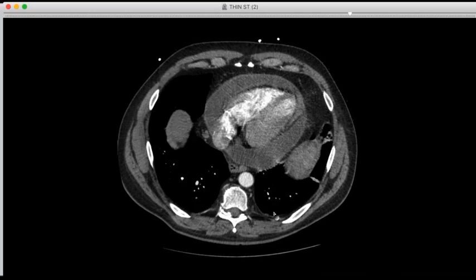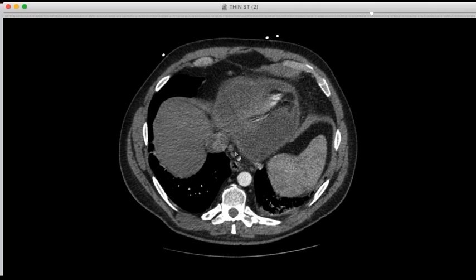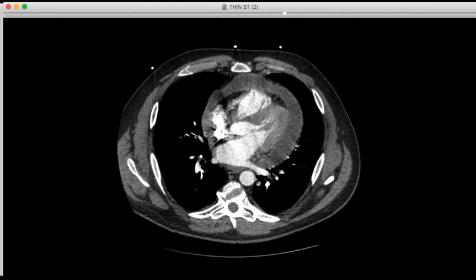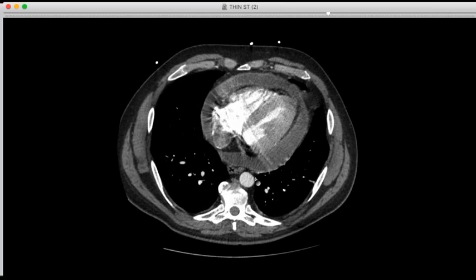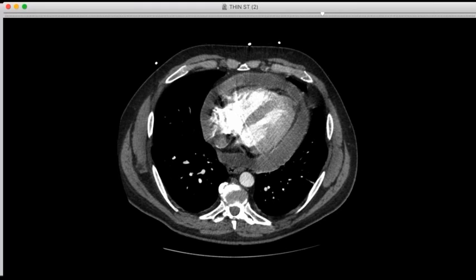Well, that's an interesting fact. I like your idea maybe of the surface area. That's a pretty sizable area. You do have almost as much on the right. It may have something to do with lymphatic drainage as well. Yeah. And then the adjacent lymph nodes are swollen. This is another case of presumed viral pericarditis, which is usually the most common cause. Summer is supposed to be the Coxsackie pericarditis season. Yeah, that's true. I'm not sure if we see a lot of Coxsackie out here, but it's probably everywhere. We get the West Nile and some of those too in the summer.